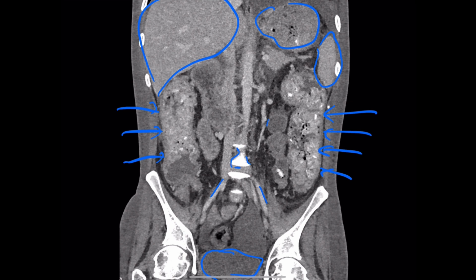Okay. Listen, here's a little small bowel loop. And it is really thin-walled, as you can see here. Whereas the colon wall is massively thickened compared to a relatively normal colon wall there. Swollen colon. Swollen, edematous, inflamed. And in fact, we can know there's inflammation because there's little areas of fluid just here and this big one here in the pelvis.